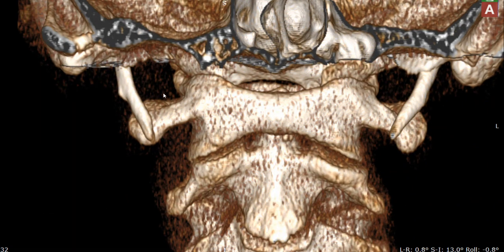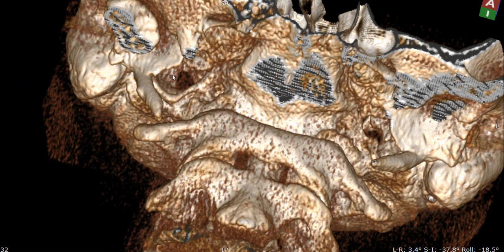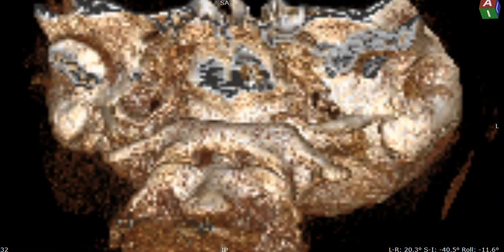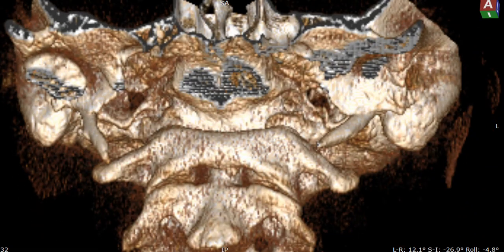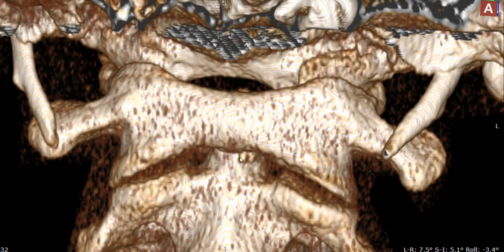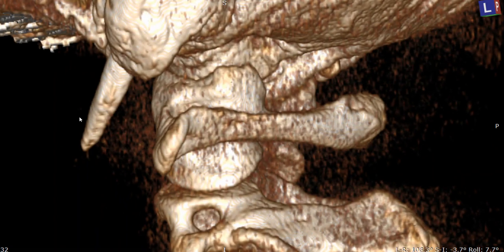Depending on where your jugular vein is, we can actually look at where your foramen hole is right here. That's where the jugular comes out, and I gotta see how large that is because it might be eroded. So we'll look at that from the top. But other than that, this is where we were talking about the calcifications that happen right there. These are obviously from some sort of damage. You can see how much more space is on the left, not too mangled in there.